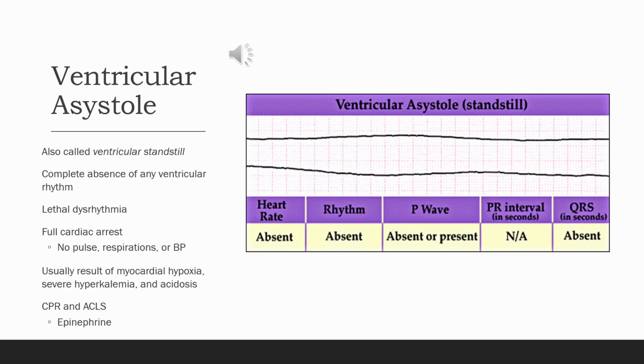In our assessment of a patient who is in asystole, the patient's not going to have a pulse, they won't have any respirations, they won't have a blood pressure, and they're going to be unconscious due to the lack of cerebral perfusion. As far as our treatment and management, asystole is a non-shockable rhythm, meaning that defibrillation is not indicated.